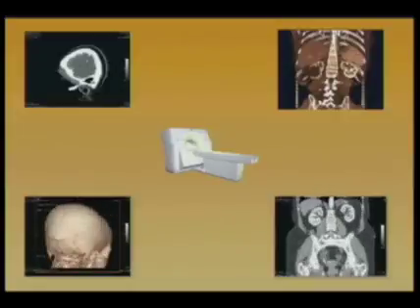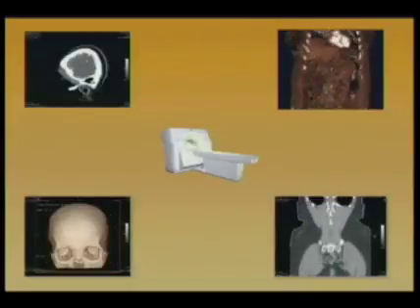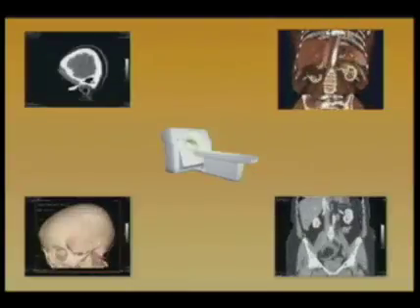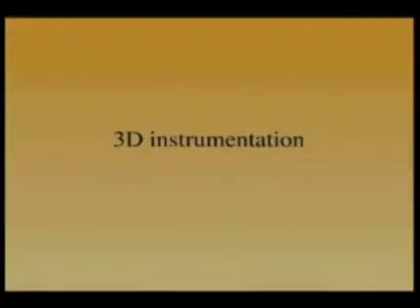Now, three-dimensional ultrasound has already proven itself in a short time in areas such as OB imaging and in GYN imaging, and I will not discuss those applications. But the abdomen is still a bit earlier in terms of its applicability. Let's start off by talking a little bit about 3D instrumentation in ultrasound.